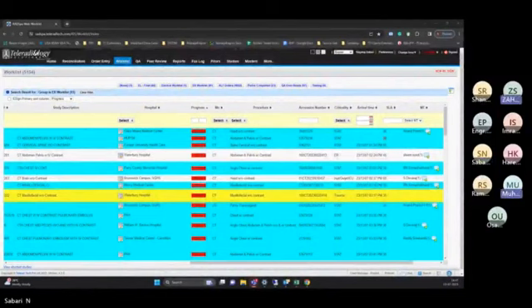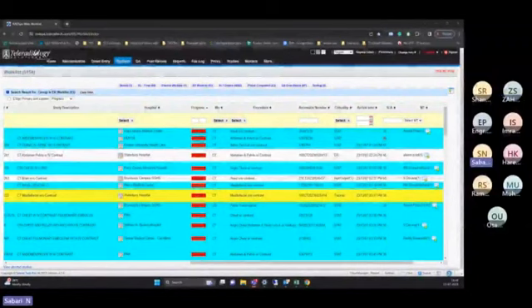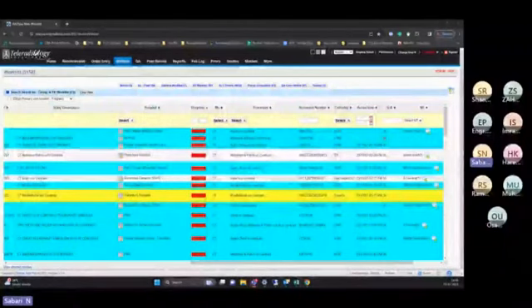बोलें फिर से. मैं ये पूछ रहा था कि जो हमारा टाइम पीरियड है 24 घंटे का तो उसको एक्सटेंड कर सकते हैं. हाँ कर सकते हैं, क्यों नहीं कर सकते. See, one second. See, the deletion, it is not a mandatory option. So if you want, then only we can configure. If you don't want, we can completely disable that. So not even a single study will delete from your application.